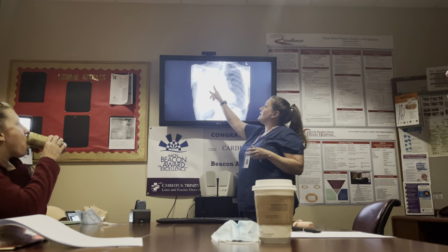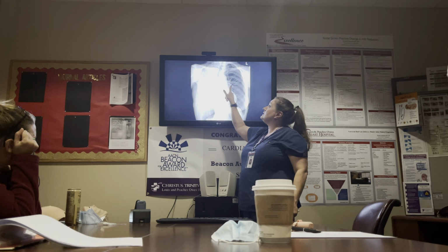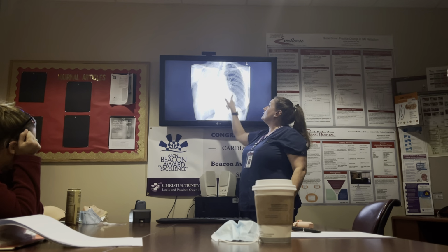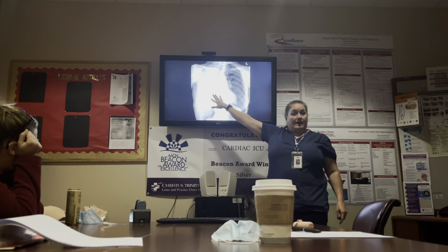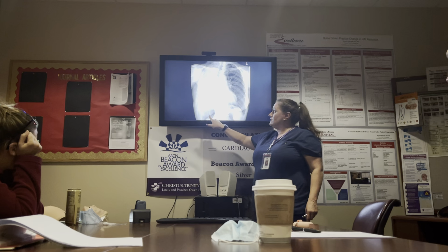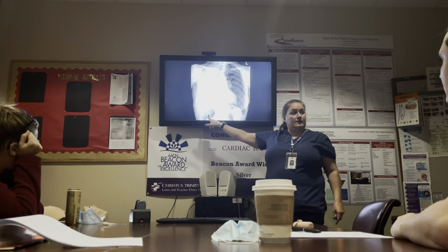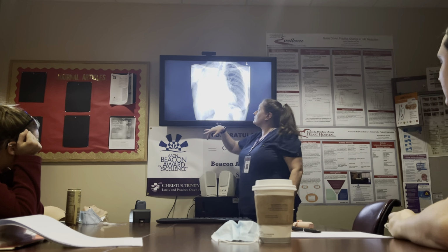It sits there. And you can tell because there's the stump of the mainstem bronchus, and see how this buds out and goes like a tree with branches. So they're just gonna chronically have that, okay? Gastric bubble, they've got some ileus here, there's some colonic stuff down here. So gastric bubble here, colonic stuff here, so yeah, this is somebody who's pretty sick.